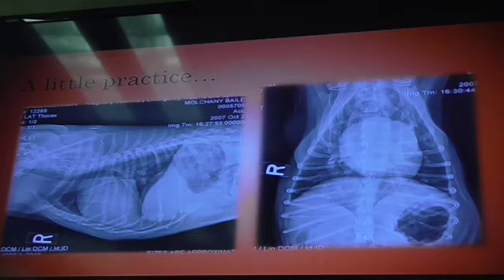So we have the caudal vena cava coming into the right atrium, down into the right ventricle, out the what? Main pulmonary artery. Okay, so when it's circulating through the pulmonary tissue, it comes out the heart as arteries. Remember, everything exiting the heart is arteries. When it comes back into the heart, it's entering through the veins.